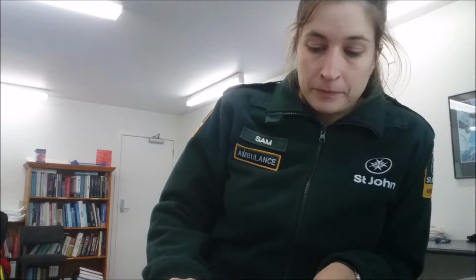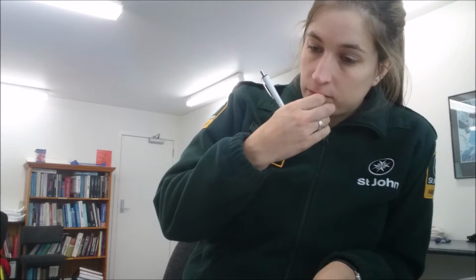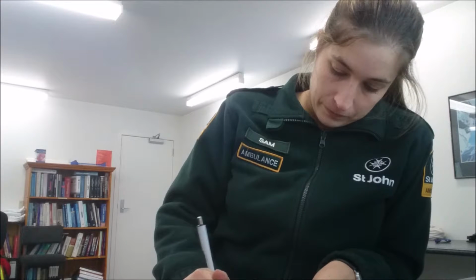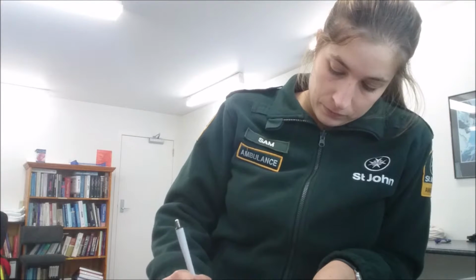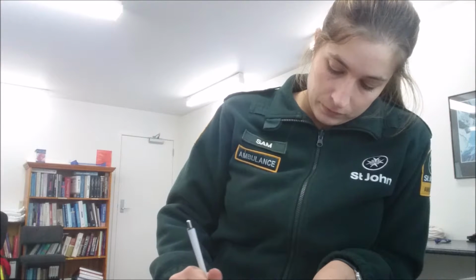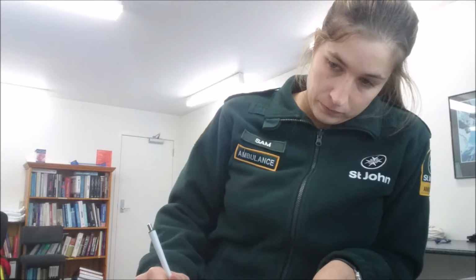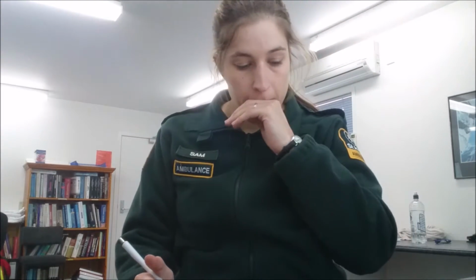Number 7. It's a 60-year-old female complaining of a headache, central chest pain radiating into the jaw, and shortness of breath. On examination, her medical history: she is a heavy smoker, has ischemic heart disease and stage 2 moderate hypertension. Her blood pressure is 160 on 100. She openly does not take her prescription medications, which are Cilazapril and Diltiazem. You can get that information anytime throughout the assessment.